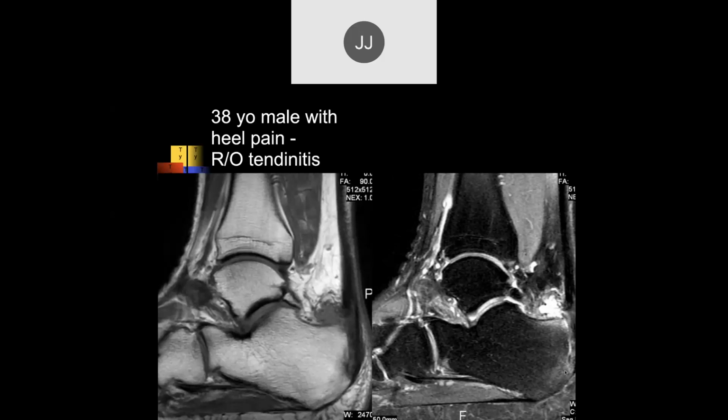So the bone then, you get a lot of granulation tissue, and the bone will grow into the tendon here. Notice also this is a typical location where you can get osteitis of the bone, post-traumatic, and this can lead to hypertrophic bone formation in this location, which we call the Haglund deformity, which we'll see in a minute.